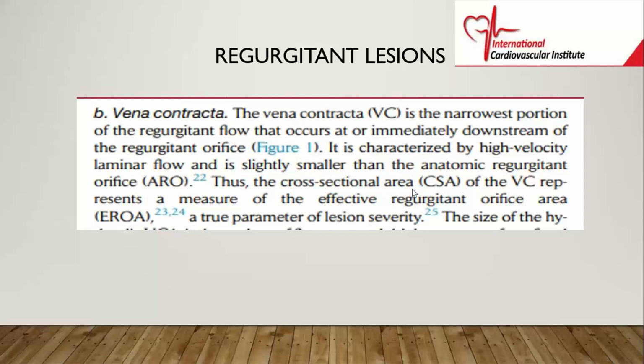We did discuss the evaluation using color flow Doppler evaluation of regurgitant lesions, and there are a number of things that we can look at when we have a regurgitant lesion, and the vena contracta is one.